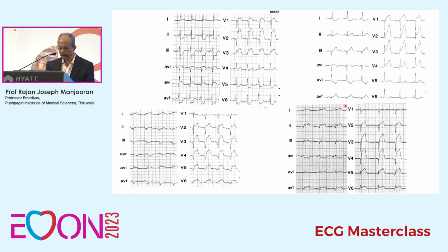These are 4 electrocardiograms. Are there any volunteers from the electrocardiogram to tell whether, in the first one, where is the occlusion? Is it proximal to S1, proximal to D1, or is it distal to one of the arteries or distal to both the arteries?